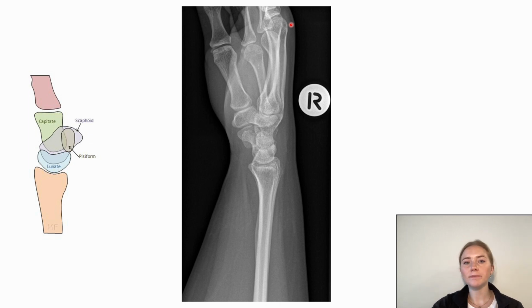That was alignment. Lateral views are the best view for identifying perilunate and lunate dislocations because you can see the lunate well. So once again, here is an actual radiograph showing that. The radius, and then you have the lunate that's sitting nicely in that cup and saucer with the capitate sitting there nicely in line as well. So that shows good alignment.